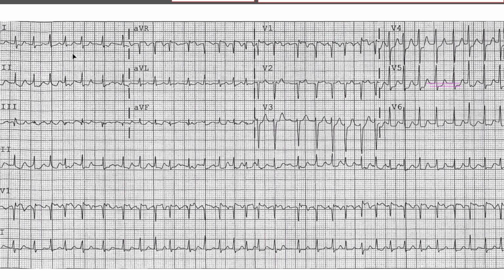Versus if you were to take a look at lead 1, maybe you have a little bit of depression there. Maybe you have a little bit of depression there. Maybe, it's a big, big maybe. Lead 2, you have a slanted slope here. We have definite ST depression. So I'm not sure what's going on here. This is not confirming anything for me. It is raising my suspicion. However, over here, it's clear as day. There's a little bit of ST depression.